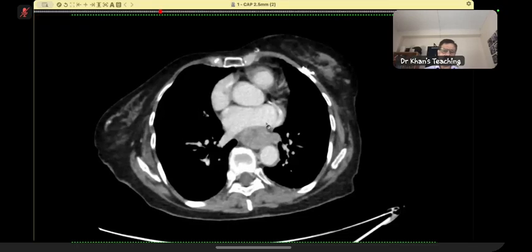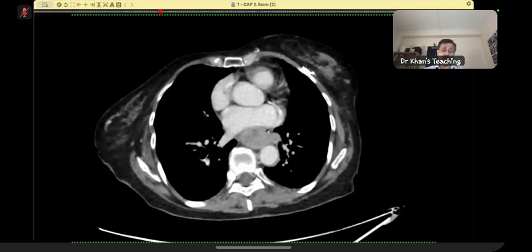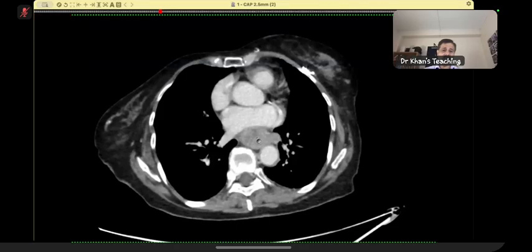On a CT scan, this is taken as a sign of pericardial invasion. Remember that our sensitivity is not as good as EUS, but on a CT scan, if you see this sign, you can call it. Please remember, if pericardium is invaded, it still is a T4a tumor, technically still operable. But having said that, this CT sign should be pointed out.